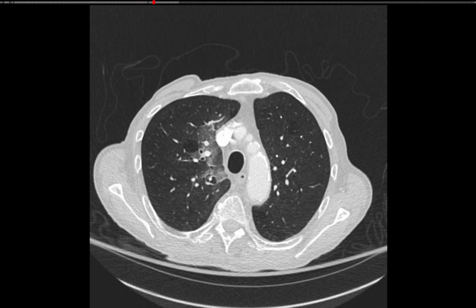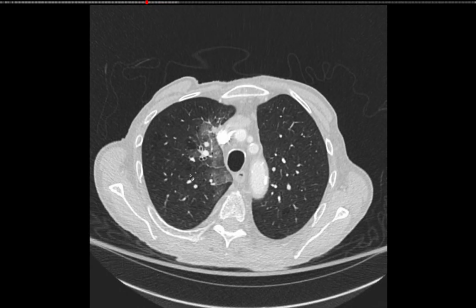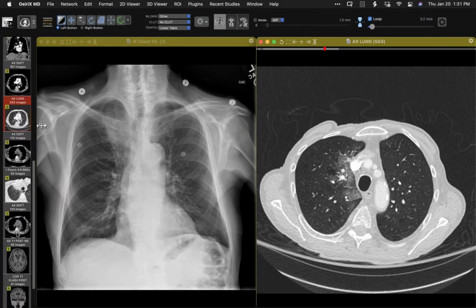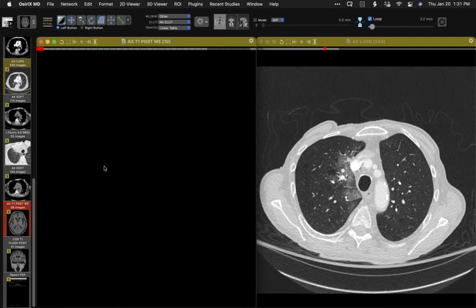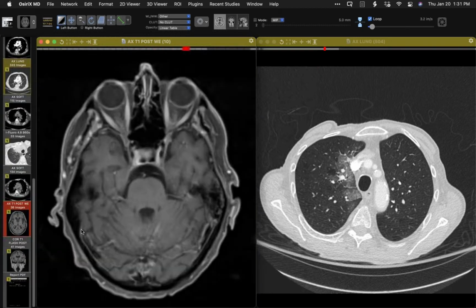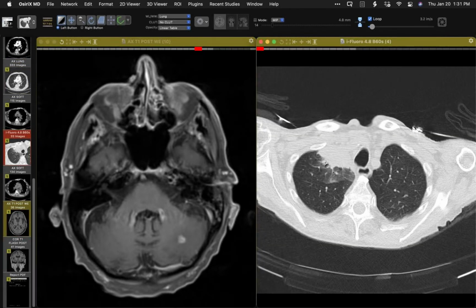Interestingly, more inferiorly, presumably this is all an inflammatory process with lung water and peribronchial fluid cuffs, but an intense inflammatory reaction, presumably. I don't know if he actually had symptoms, but indeed he was found to have cerebral and cerebellar lesions.